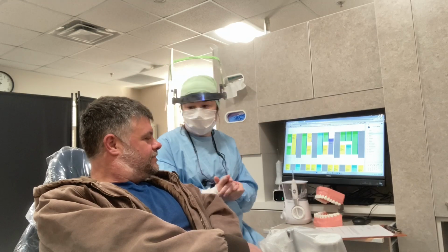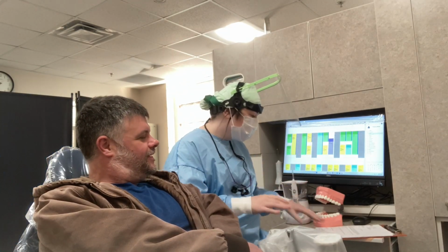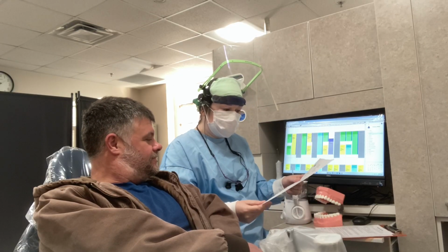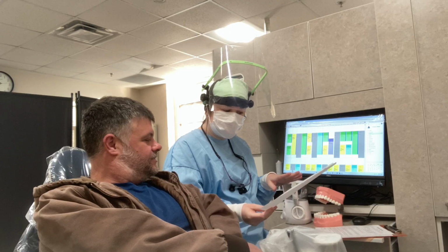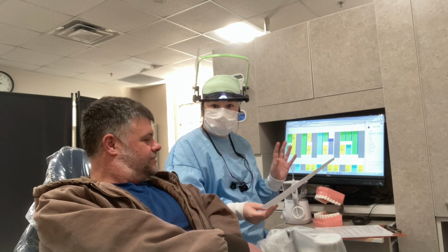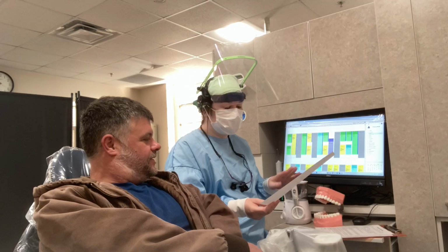For today, we're going to be going over your x-rays. We call them radiographs, so if I say those words interchangeably, that's what I'm talking about. First thing I have for you is the radiology notification form. This is specifically from our dentist, stating all the things that he confirmed that we found in your mouth. We talked about it some, but he's able to diagnose. So that's why we have a letter for you.